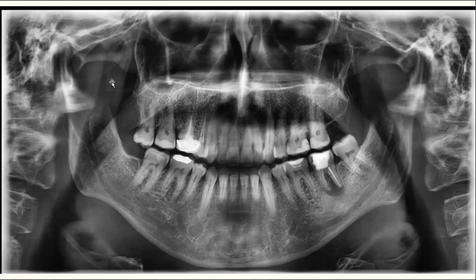We can see the coronoid process. You can see some part of it, but not that much. But it shows us the arch, the zygomatic arch. So we can see there is a lesion around the lower 7. We can see the wisdom. We can see that the root canal treatment here with the crown is overhanging somehow. We can see over eruption of the upper 8, and these are the things that we will be looking at.